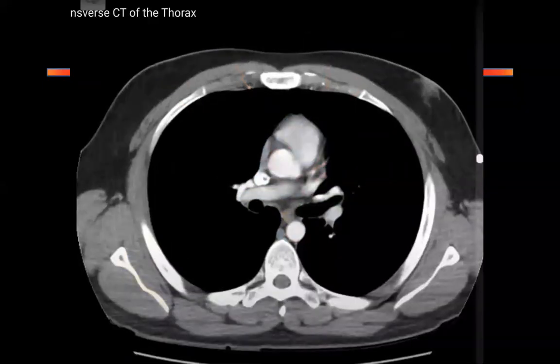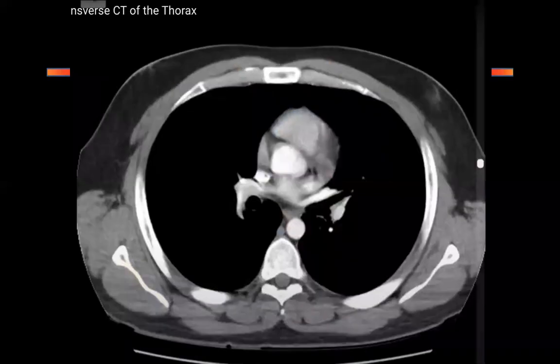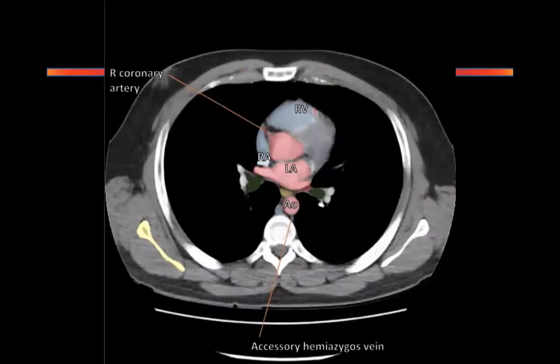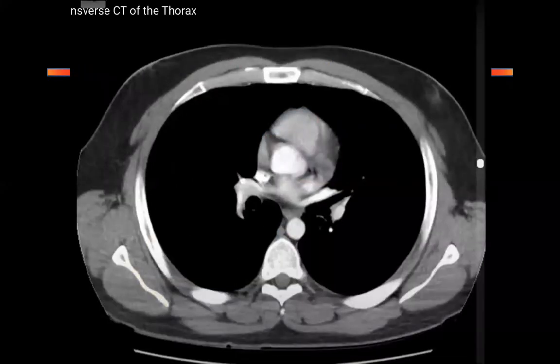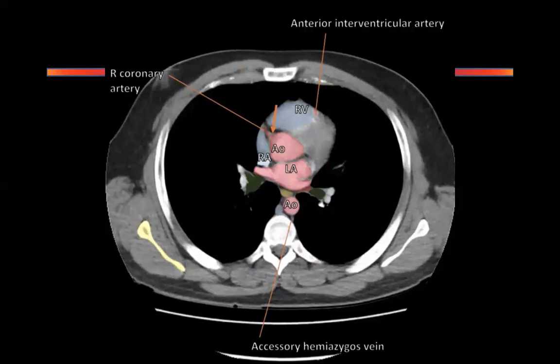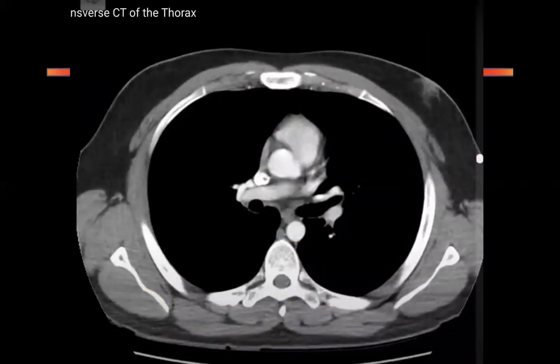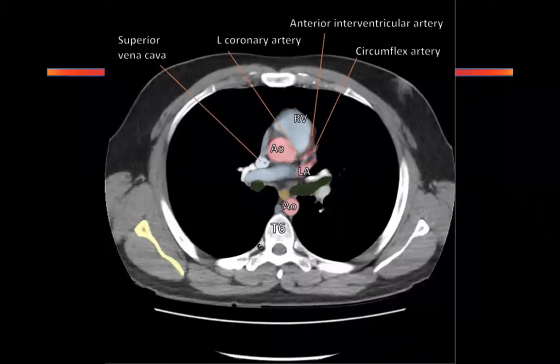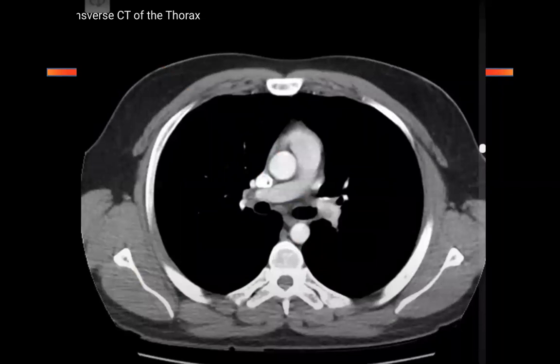I've gone back again, okay? Now, watch that aortic outlet, the left ventricle becoming the aorta. And then watch what is happening next to the aorta. This area. SVC. Okay? Now I'm going a bit further up.